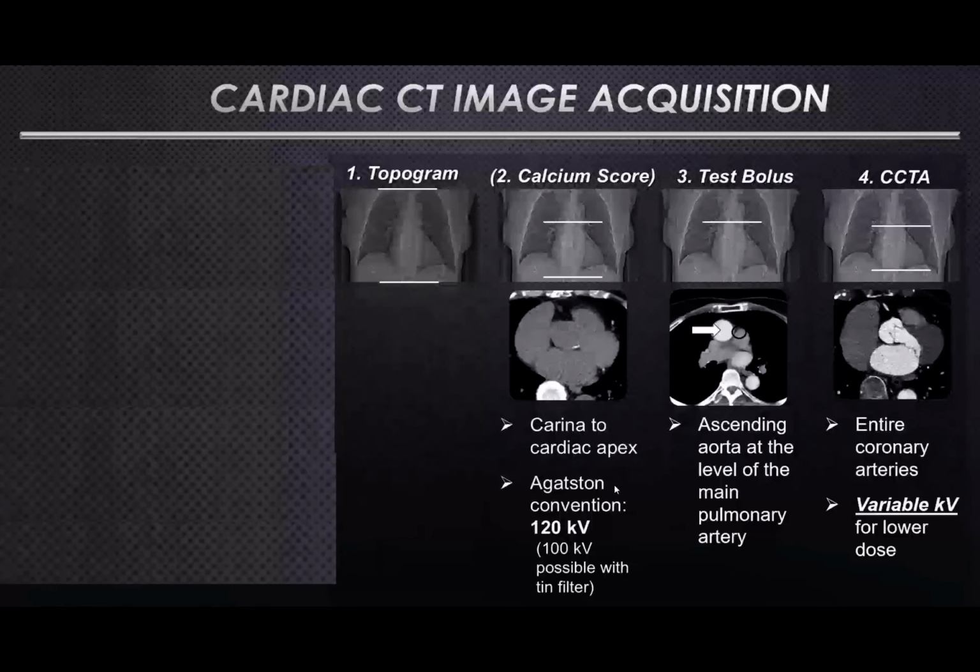With most recent scanner software on the 3rd generation dual source CT systems, you can also perform it, and this is standardized by several studies with 100 kV. This is facilitated by a tin filter, and this may reduce the dose for the calcium score. And when we have this unenhanced image, this will be the image impression you will get on the axials.